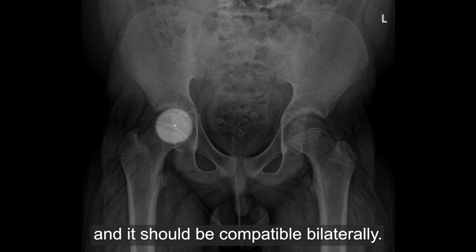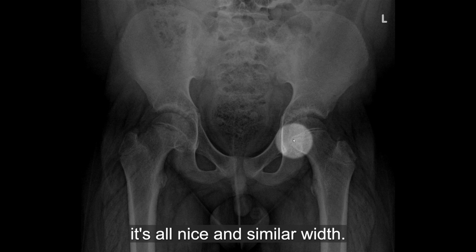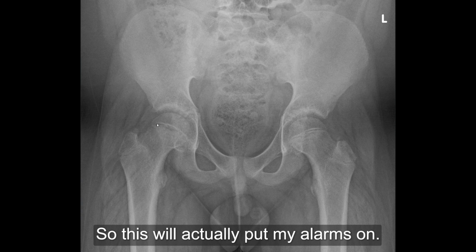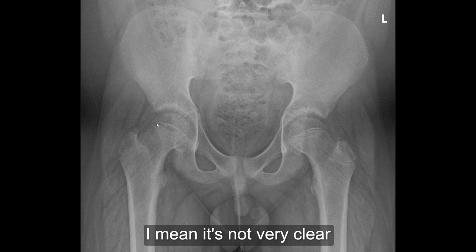It should be comparable bilaterally. There shouldn't be any widening. If you go from here to there, it's all a nice and similar width. But if you go from here, you can see it's slightly narrower here and slightly wider there. So this will put my alarms on that there may be something there. It's not very clear and it's not definite, but I would get worried.